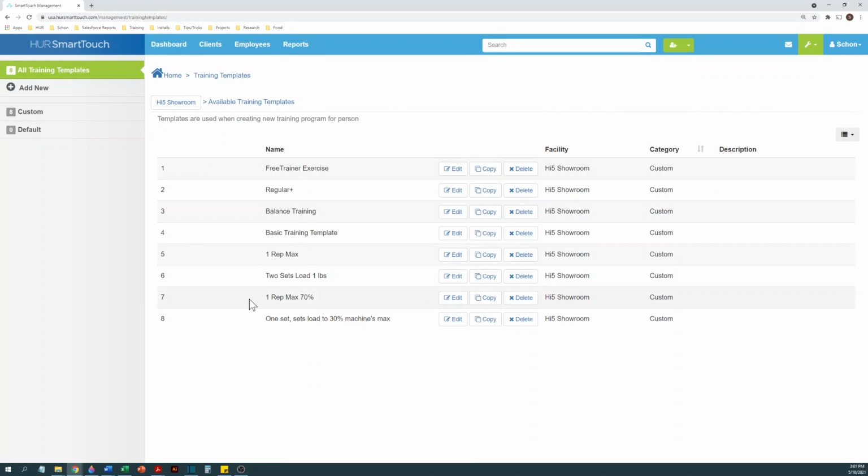Below, you'll see a list of training templates that have already been created, assuming at least one has been created. When your equipment is first installed, an initial training template with all of your machines added to it is usually created for you.